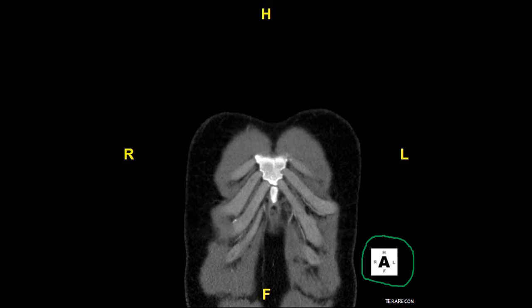Next, we can see some distinct white structures, I'll outline those in yellow very quickly, and some distinct green structures, which I'll just circle one or two of them in red right now. You should know by now that bone shows up white on all the CT images we have looked at. Therefore, we can see the sternum and the xiphoid process. And I'll just label the sternum with an S and the xiphoid process with an X.